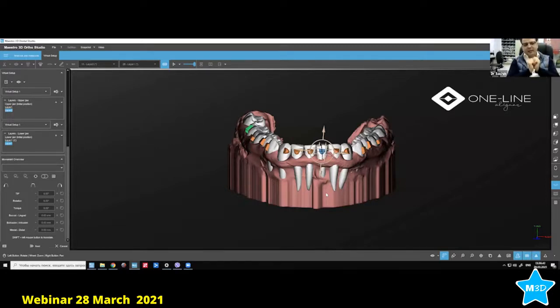So Invisalign, for example, has come up with a G8 smart force that they have compensated so that the force will be equal on all the 6 teeth. But actually on our software, when we use it, we should know that it might be that the canines and the lateral incisors intrude a little more than the central incisors because the force gets less as we move farther from the teeth which are holding the aligner. I think that will be clear for everybody. But the attachments here will help us to keep at least relatively equal forces on all the teeth, right?